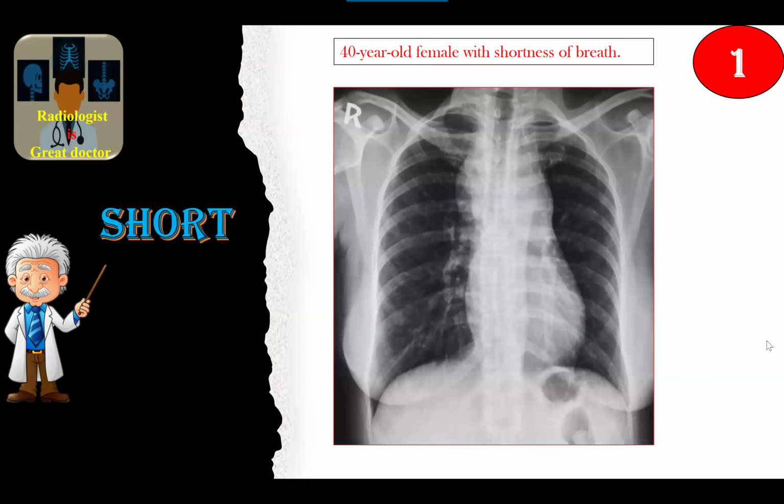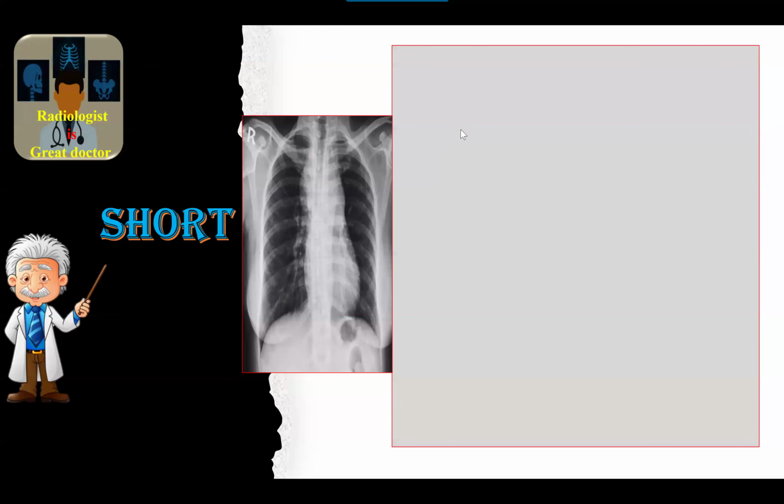Just tell me, okay, this is not oral, so just a description. For example, the first item: frontal chest radiograph shows... We start with positive, negative, then diagnosis and management in brief sentences.